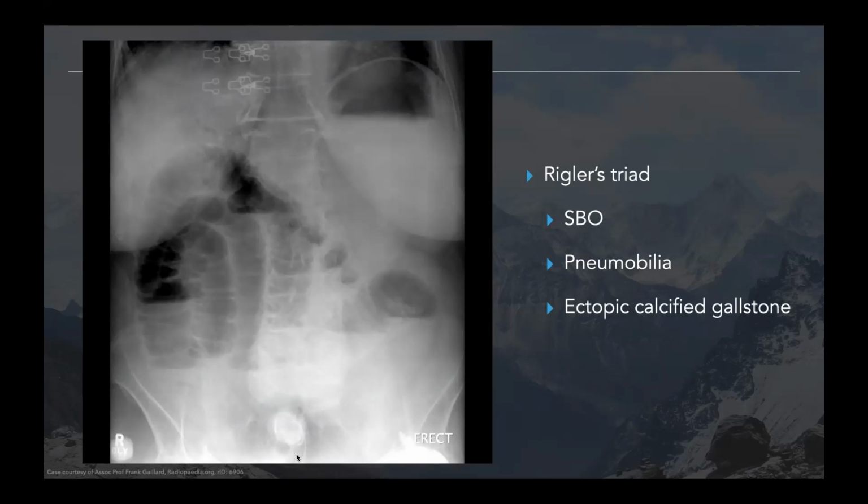Small bowel obstruction, calcific density here, I don't know, discussed in my senior CT scan, etc. You discuss the common causes of small bowel obstruction, the management, and that would get you out of hot water. But if you get the diagnosis, that's great.